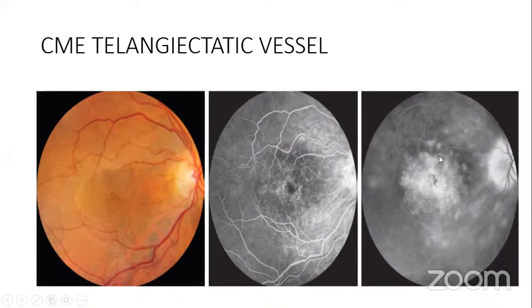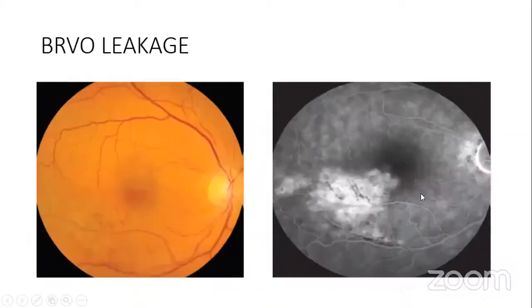So at this time, you expect that this whole area should be dark. The retina should have emptied out, but you have leakages down here. There are also leakages. Okay. Now, the patient in this has branch retinal vein occlusion, inferior branch retinal vein occlusion. You would have some hemorrhages and then have some fluid around this area.